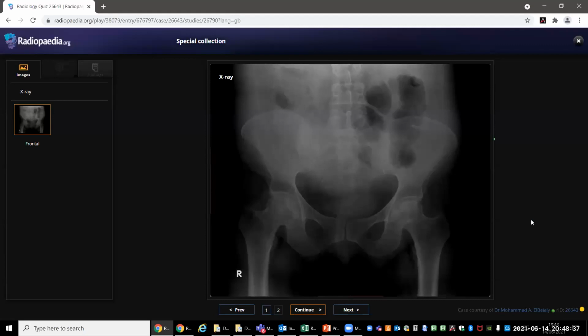So you've only mentioned just two possible causes here. Yes, looking for ankylosing spondylitis. What else? Actually, I do not see any surgical staples in the pelvis. Give me three more possible causes of this. It does not have to be on this radiograph. Okay, it can be due to, in renal transplant cases, immunosuppressive therapy, if the patient is on immunosuppressive therapy, and the patient is taking steroids for some asthma or any allergic diseases affecting the patient.